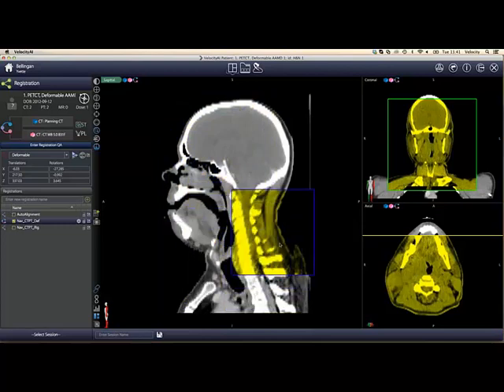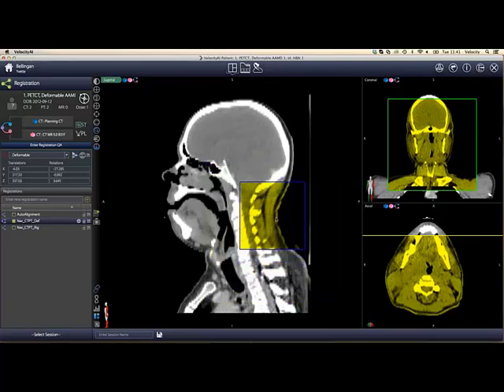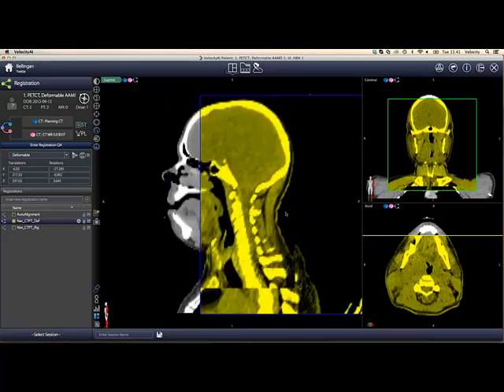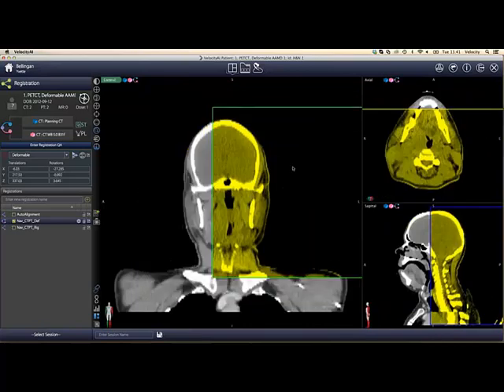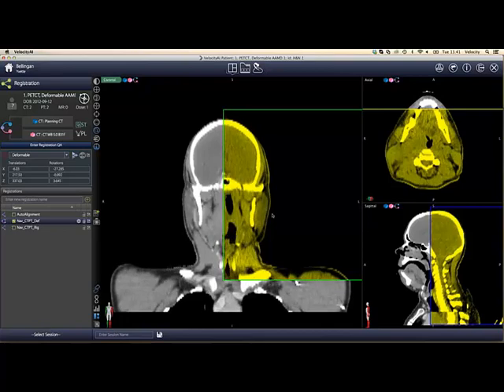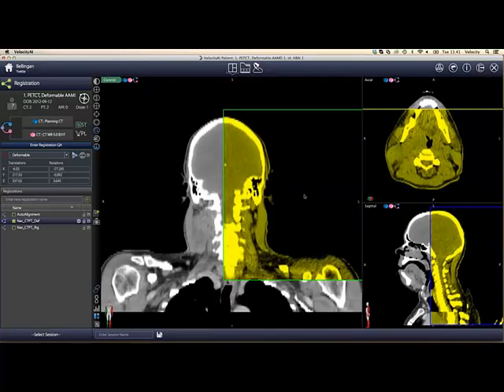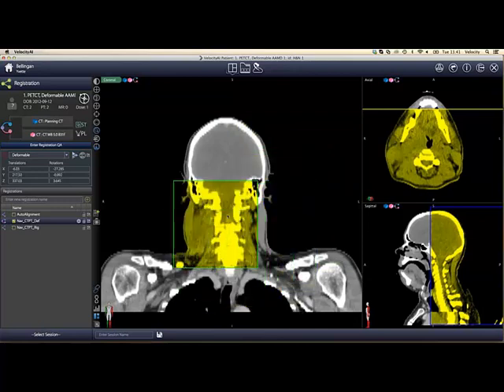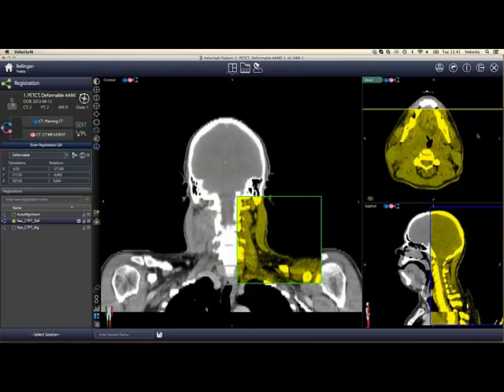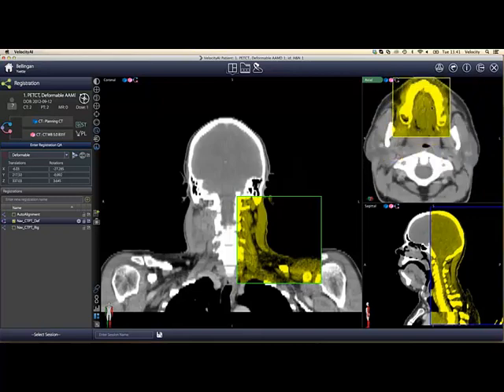Now, I've often seen the radiation oncologists, when we get on site, they like looking at soft tissue, and they like looking at a side-by-side view. And what you can do, if you place your cursor just on areas, and if you've got the anatomy and you know the pathology, you can review that as well and then have a look at these areas. So those are the visual tools. Now when you're done with the visual tools, we've got some really nice QA tools that the software has, but you have to review them all. You can't just rely on your QA tools.